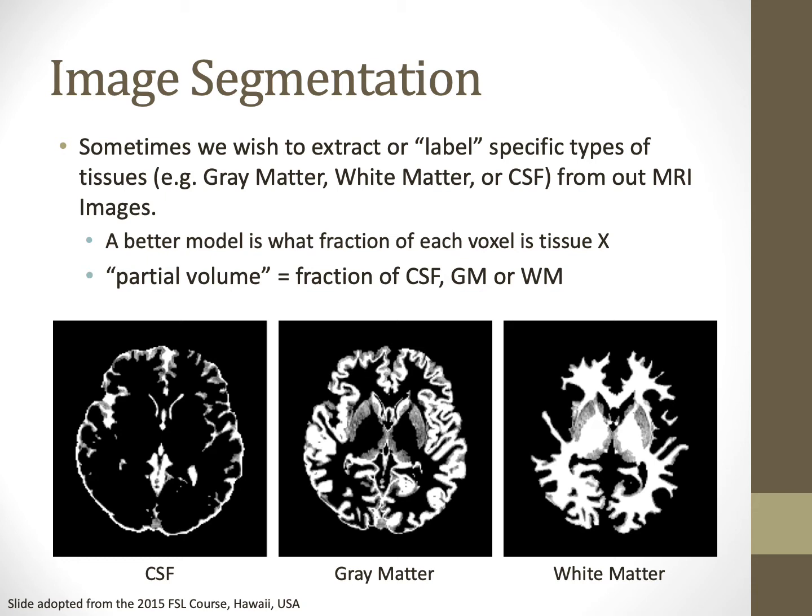In practice, this image segmentation can be binary, where the resulting segmentation or brain label is either the region/tissue type of interest or it is not. Alternatively, image segmentations like the one seen here can provide an intensity or probability of an individual voxel being part of a certain tissue type. Images like this are generally referred to as partial volume maps.